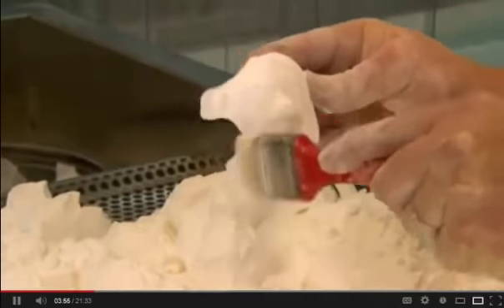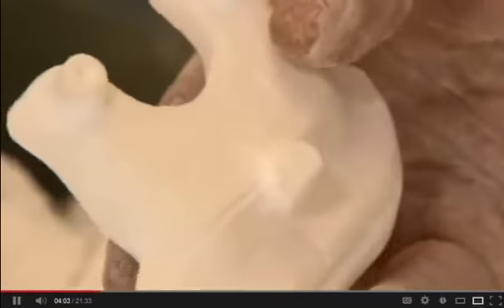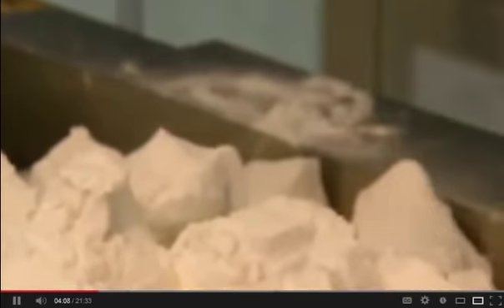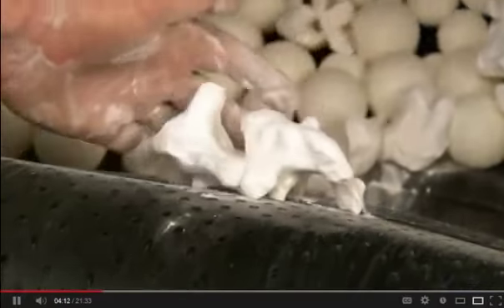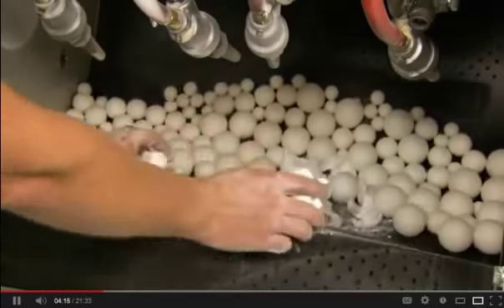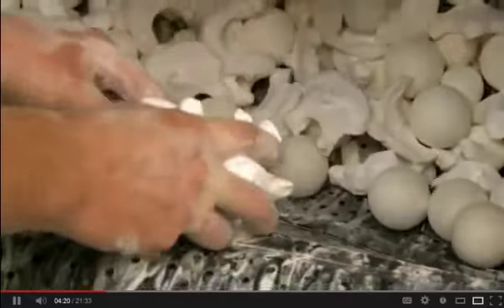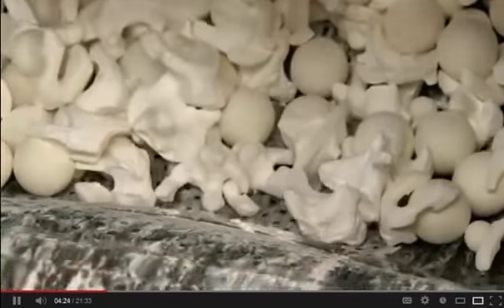They brush off the bulk of the remaining powder. The posts on the bottom are the points at which pins affix the template to the bone during surgery. Next, the templates go into a tumbler containing plastic balls and air jets. As the drum rotates for 20 minutes, the balls knock off, and the air jets blow off most of the remaining powder.